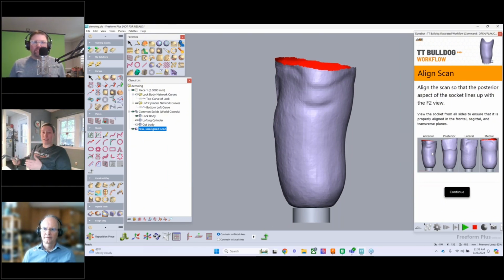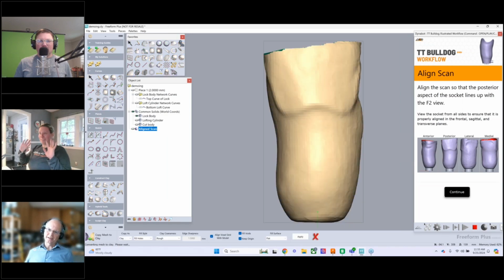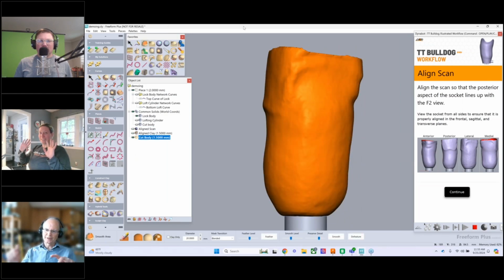What is happening behind the scenes is I already told it that I want none of these options turned on down here, which, if you're not a Freeform person yet, we can go into later or answer questions. Essentially I set it up because I knew that's how I want it to be, and you need to get the lock on the bottom, reference these, continue. And it's cool, you can see your haptic arm there because you're doing full 6 degrees of freedom.